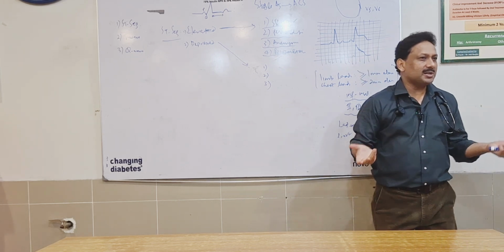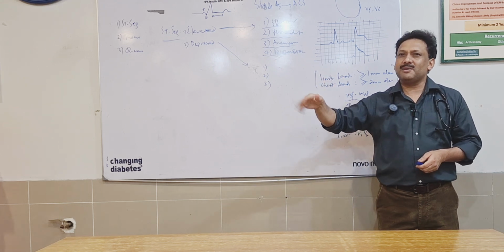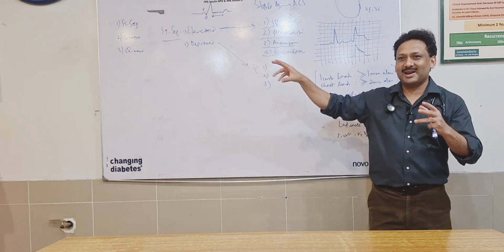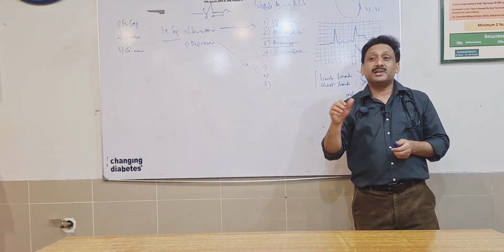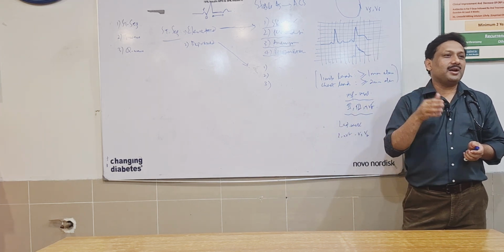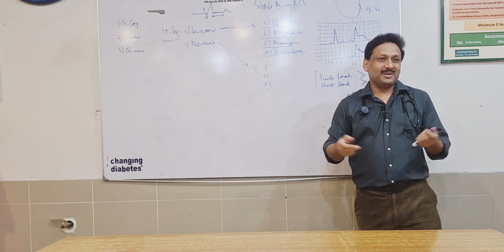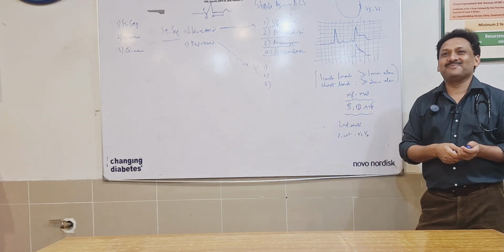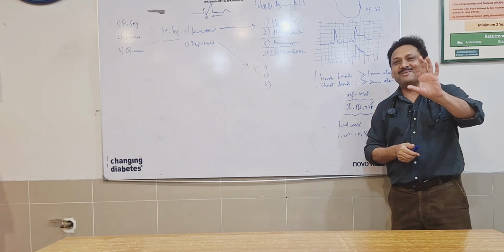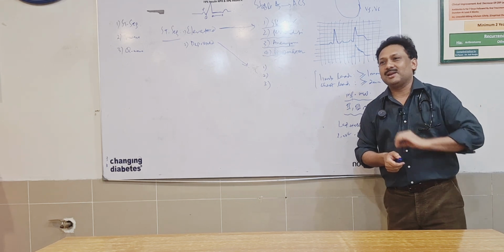And pericarditis, is it wall specific? You would find elevation in all the leads, all the chest leads, limb leads. One student once asked me, as I was telling him this is how to differentiate, he said that if a person is very unlucky and suffers from infero, latero, antero, septo, postero, right myocardial infarction, sir, how would we know? I told him, well, that person, if that unlucky, probably doesn't deserve to live. However, you won't usually find that kind of situation in practical life, right?